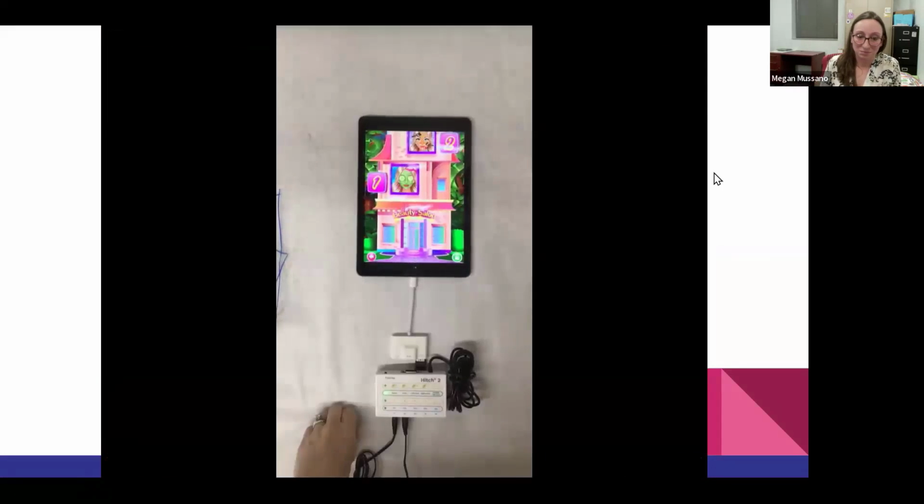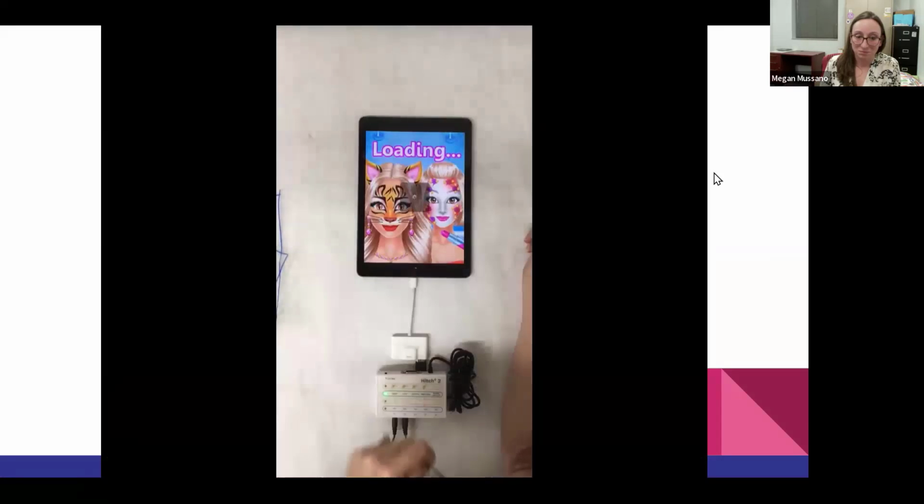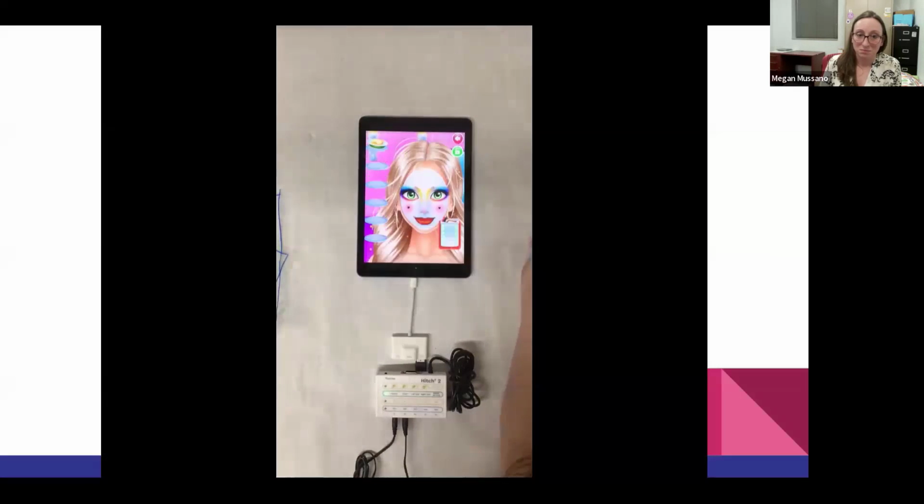Let's go ahead and test our custom recipe and custom gestures. So when we click the green space, that'll be our first one. That will be our soap. Let's test it. It swipes down and around. Very nice. Let's test our next one. That will be the brush. That was our green enter. Fabulous. We checked her off.